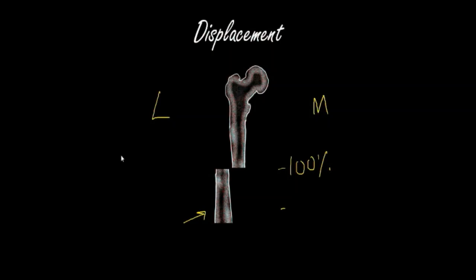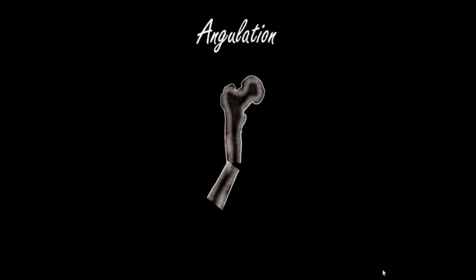Remember, regardless of whatever fracture it is, it's always the distal fragment. I have to stress that, quite an important point. It may be that the fracture you've had is actually angulating. Again, the same principle applies: which way is the angulation taking place? Is it medial, lateral, posterior, anterior, dorsal, volar? It all depends on which bone it is, which direction the angulation is taking place. But it's always worth describing how much angulation is taking place.